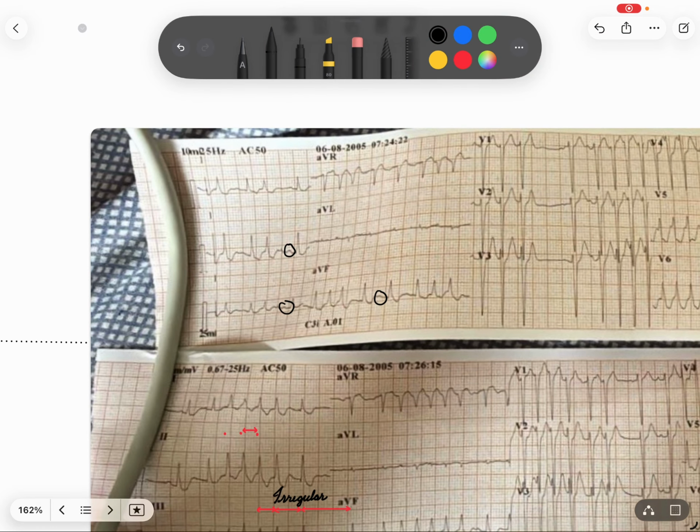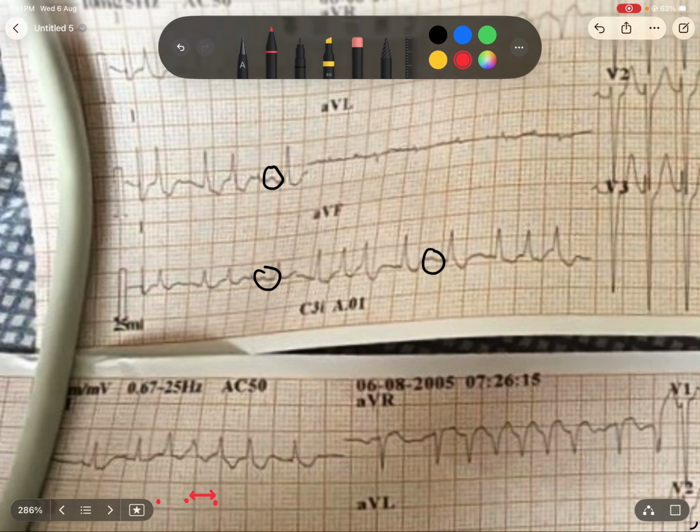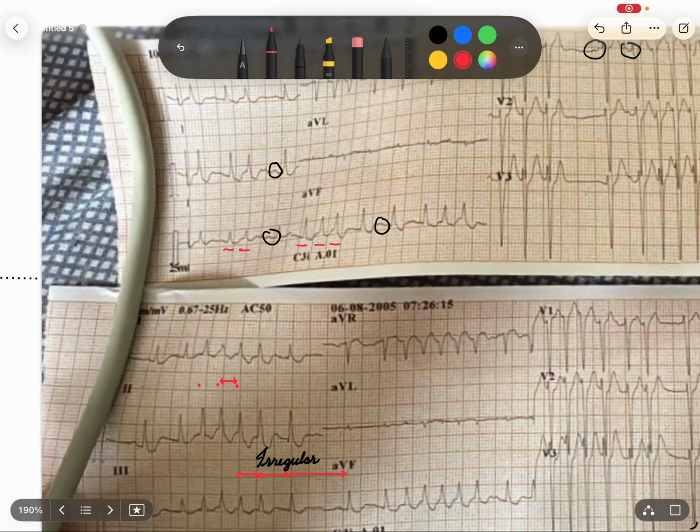and here. So lead 2 and V1 are the main leads where we see the P wave and look for it. And there are other waves that you might see which don't really have a P wave, which are like this. So there is no clear distinguishable P wave.